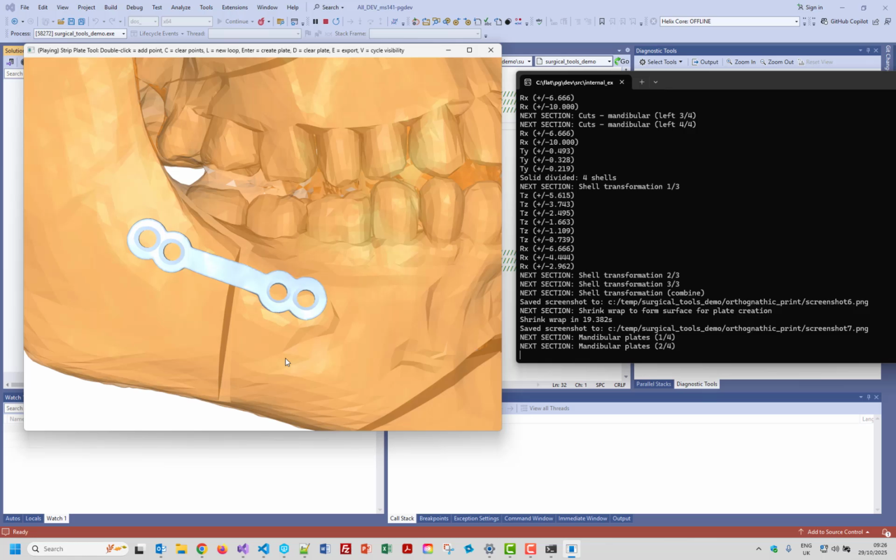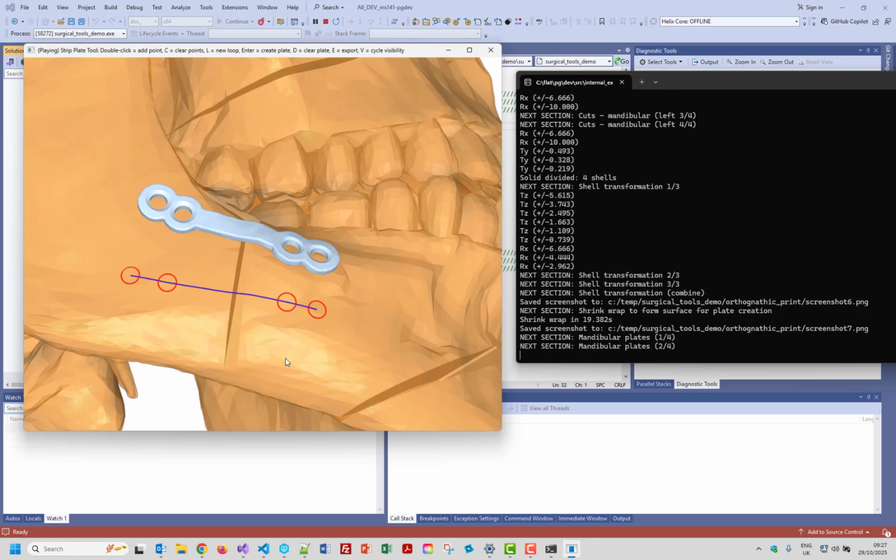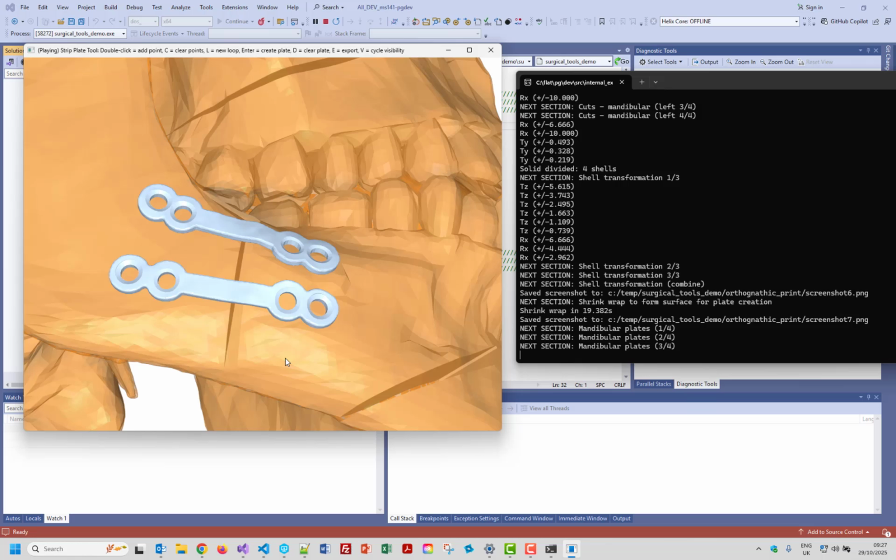We then imprinted new edges onto the skull, or a copy of the skull, found the inside faces from those edges, and used those as a surface on which to thicken using Polygonica's 3D offset into the strip. And then we did some remeshing, some smoothing, and some tidying up of the results, just to make sure it looks nice, and it's not going to be sharp. It's going to be a smooth surface that goes inside the patient rather than lots of nasty sharp edges.